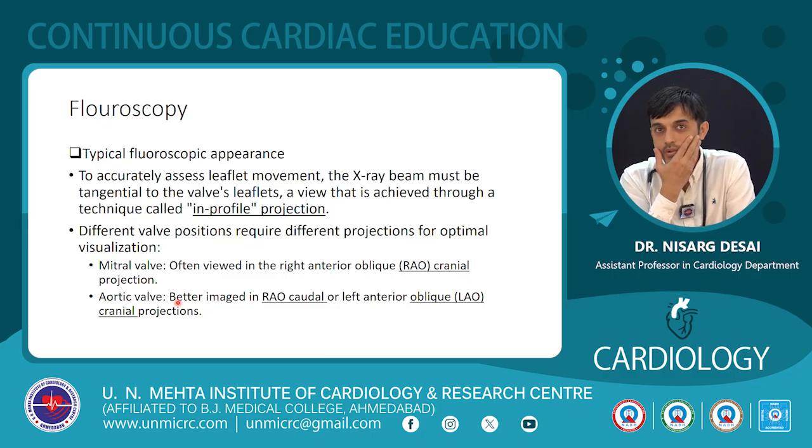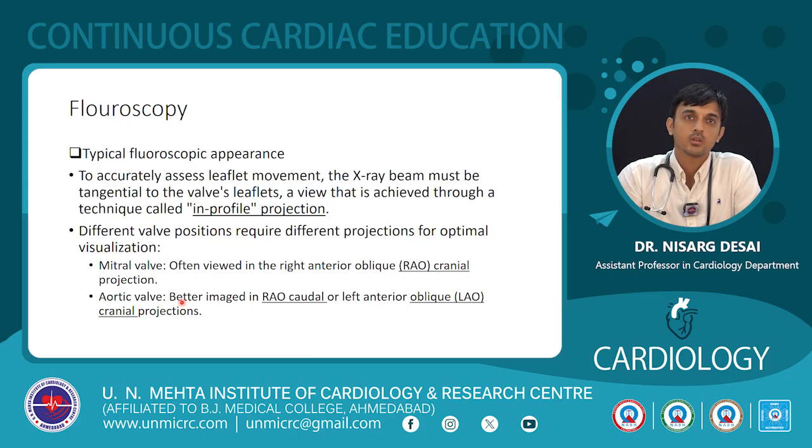So this is about the echo evaluation. Now we come to fluoroscopy. Once we have analyzed the echo parameters and we further want to know whether the patient has PHVT or not, to document it, we use fluoroscopy, and the X-ray beam that we are using must be tangential to the valve leaflet, a view that is achieved through a technique called in-profile projection.